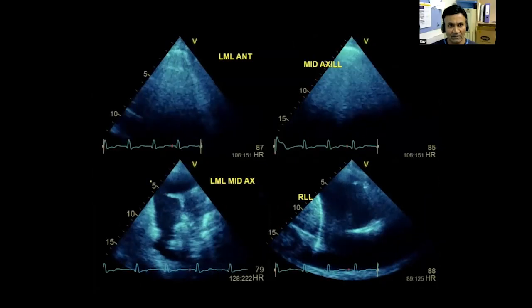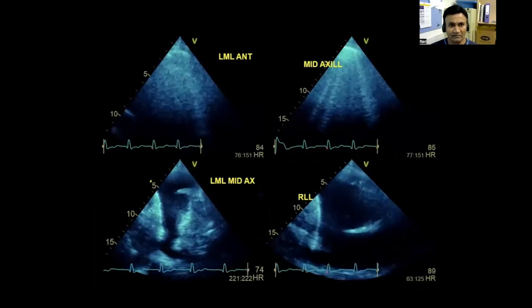So we can still call it a structural heart disease based on calcifications. For me, if you've got thick ventricles, big biatrial enlargement, valvular disease, they all fall into this patient is going to have diastolic dysfunction, with atria that big and everything. I just want to know what grade of diastolic dysfunction they have. Yeah, the guidelines don't lay it out. They don't say specifically what structural heart disease, but I think anyone with diabetes, hypertension, thick ventricular walls, structural valvular disease, big dilated atria, and small LV cavities, the classics of elderly patients, they're going to have a degree of diastolic dysfunction. Just trying to figure out how severe it is.